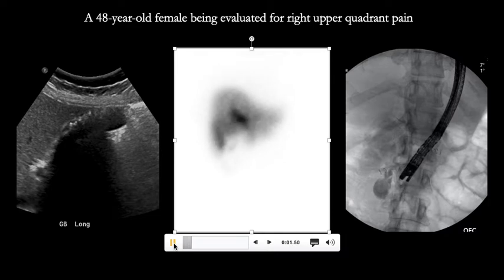And so these images are from the HIDA scan after laparoscopic cholecystectomy, and we see uptake in the liver and excretion into the biliary system, and there is a bile leak. Bile leaks from right here, the site of the cystic duct remnant, into the right lower quadrant paracolic gutter and extending into the pelvis and also moving superiorly around the liver. So this patient has bile leak post-cholecystectomy.